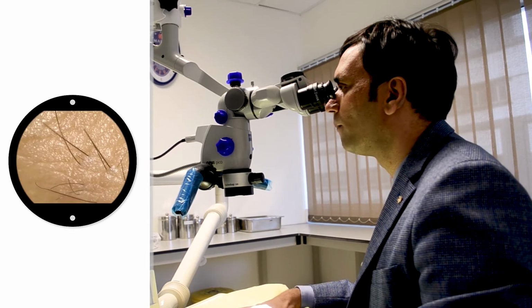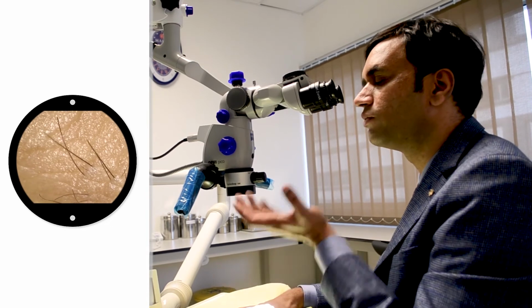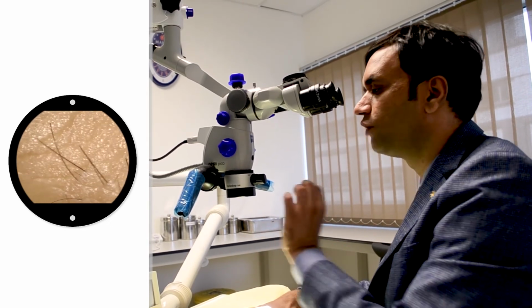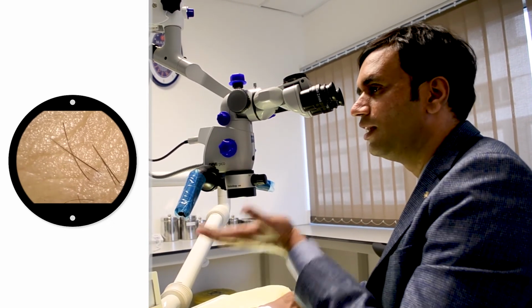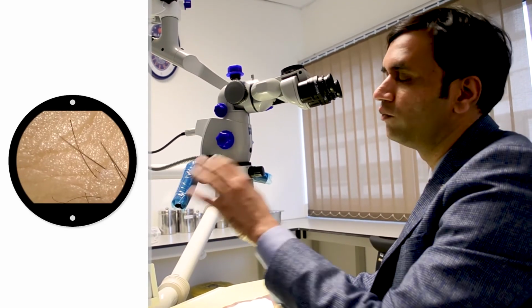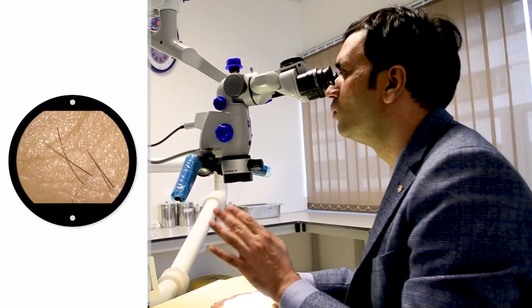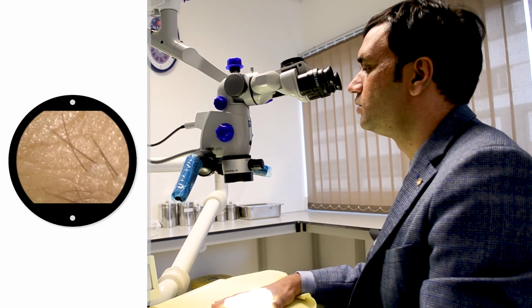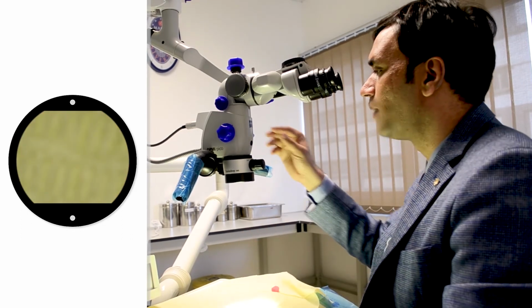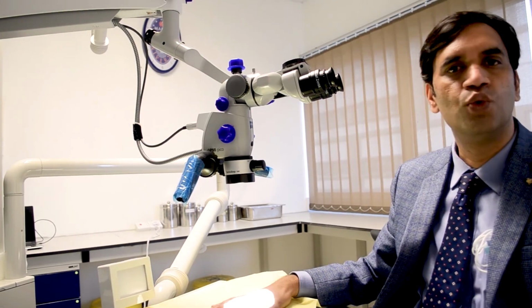The same thing will apply when you are doing a patient, where if there is a change in the distance of focal length, the thing will change. So you have to fine tune and adjust the length. Either you can modify the height of the patient, or you can modify, most likely we try to modify the height of the patient and slight fine tuning would do. So that's what I would like to explain about this magnification factor. Thank you very much.